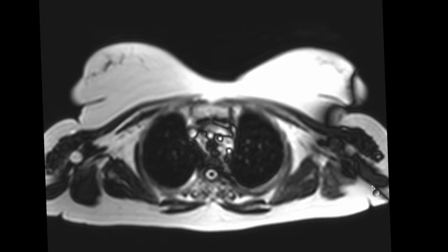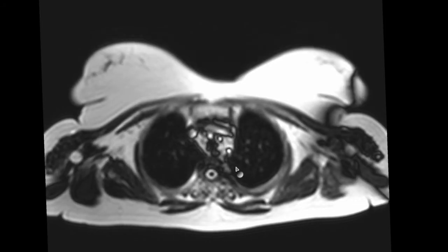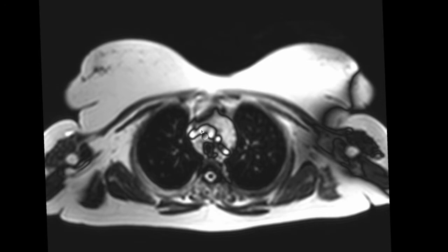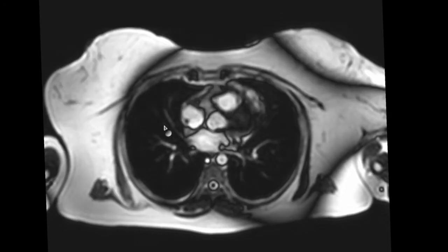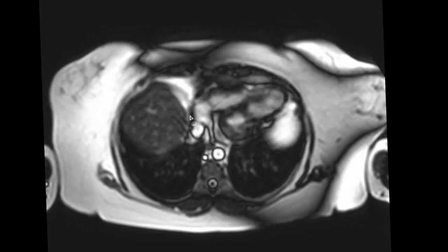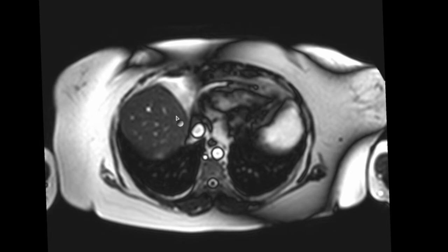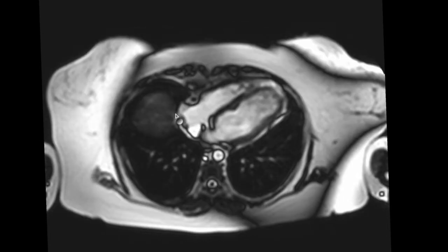Towards the basic approach to any congenital heart disease, it is much easier if we follow the blood flow pattern, that is, how the blood flows into the heart. Let's go from the left innominate vein. You can see this is the left innominate vein, which further drains into the SVC. If we follow the SVC inferiorly, the SVC should drain into the right atrium, and if we follow the right atrium inferiorly, you can see the IVC is draining into the right atrium. Make sure that there is no interruption of IVC.